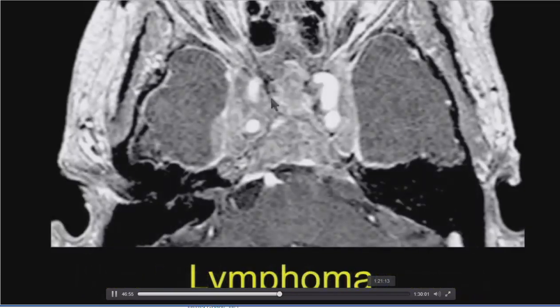They can also involve the bone. So here's a very similar case to those earlier studies. It looks a lot like that meningioma, looks kind of like the plasmacytoma. But if I look at it, we have relatively benign soft tissue that's extending out laterally into the cavernous sinuses from that central skull base. It's going back towards the prepontine cistern. And we see all those changes here on this axial post-contrasted MR. If I know the patient has a history of lymphoma, that's what I'm guessing this is.